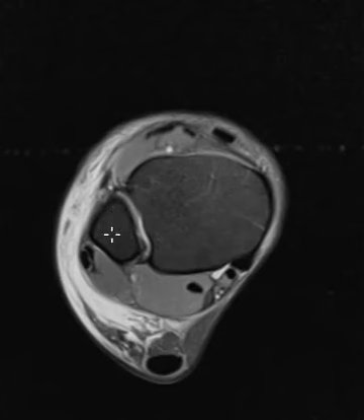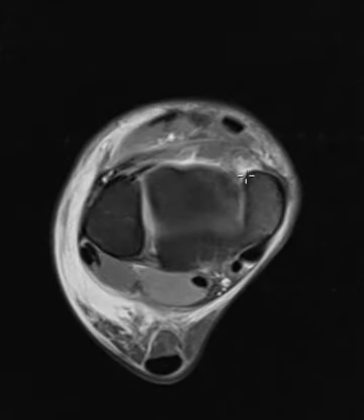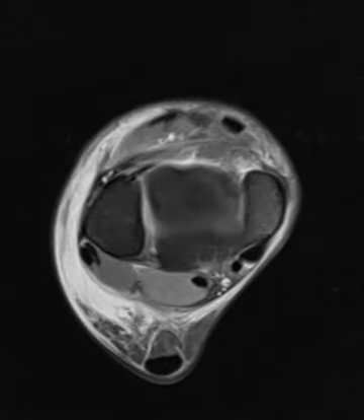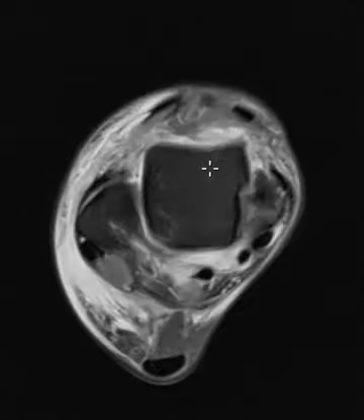Here's the fibula, tibia. We're going down and we're getting into the joint right here. And at the level of the joint or above, we see the anterior tibiofibular ligament. Now we're going to go below that, and we're going to look for the anterior talofibular ligament. Now we're into the talus, fibula, so we're looking for the anterior. Here's anterior, and again, talofibular ligament.